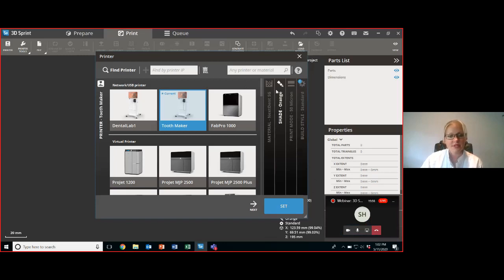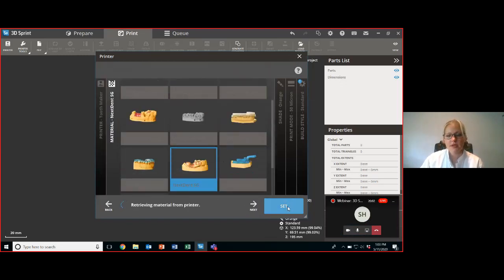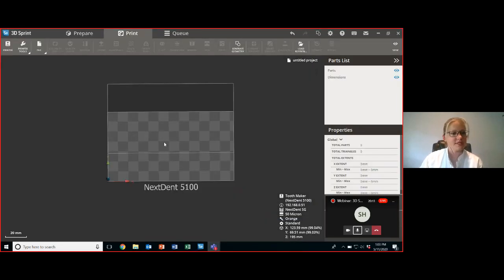The first thing that we're going to do is start with the new surgical guide update. So I'm going to go ahead and select my surgical guide and hit set. And I'm going to show you some of the new support tips. The way it works now is so much more convenient for removal on the sleeve areas. And so the seating is much easier, no more adjusting basically.